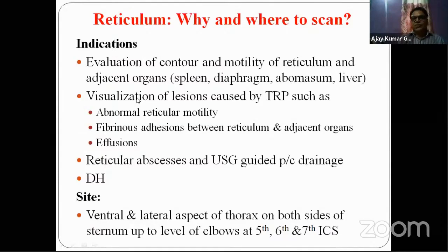Also, we can visualize the lesions caused by traumatic reticuloperitonitis, which can be detected by ultrasonography, such as abnormal reticular motility, fibrinous adhesions between reticulum and adjacent organs, and effusions. Similarly, we can detect reticular abscesses and also perform ultrasound guided percutaneous drainage of some of the reticular abscesses.